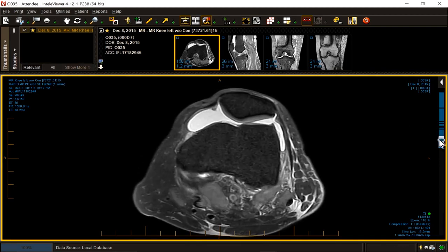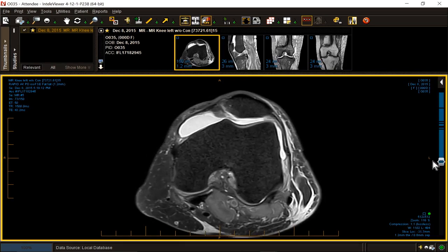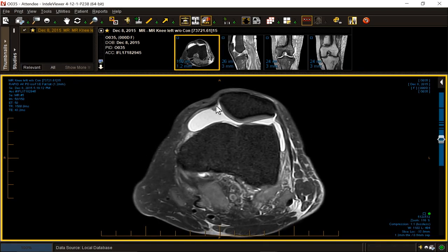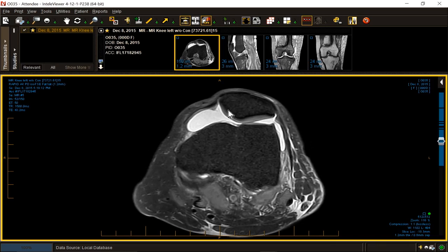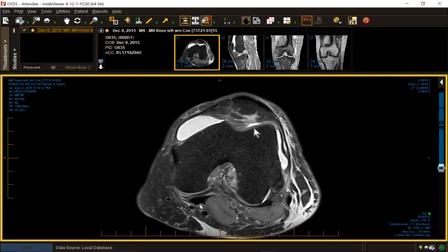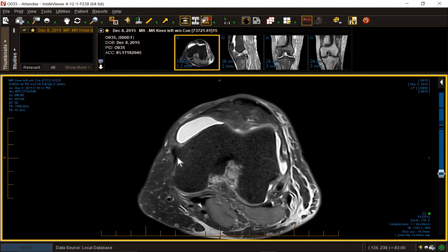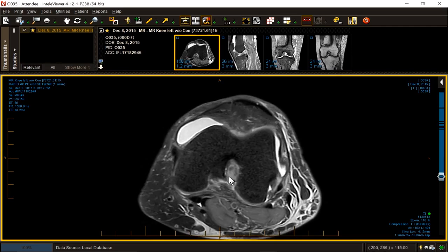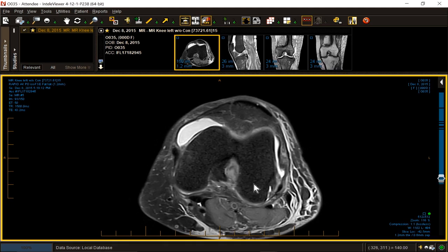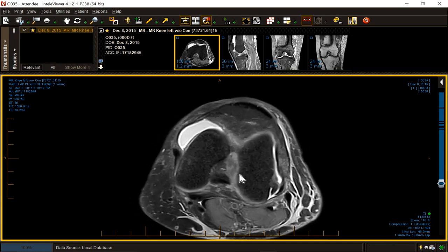And I've got some excellent looking hyaline cartilage of the patella. Nice trochlear cartilage. The patient is not dislocated. The MPFL is intact. The length of the medial and lateral facet is normal. It's got a good looking apex. Nothing's displaced. I have a swollen knee. I have an effusion. I am looking at the tibial collateral ligament. I am looking at the posterolateral corner. There's swelling superficial to it, but not in it. The PCL, normal. The ACL, not so much. The ACL is diffusely swollen.